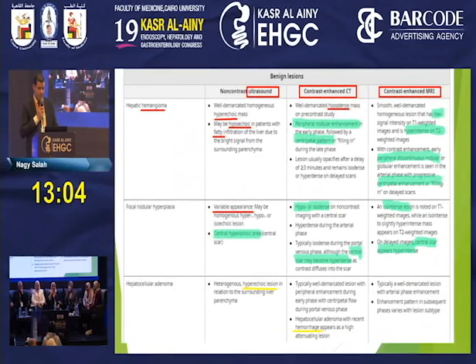delayed phases. Focal nodular hyperplasia has a variable appearance: it may be homogeneous, hyper- or hypoechoic, showing central hyperechoic scarring, hypodense on CT, and with central scarring showing delayed enhancement. Iso on T1 in MRI, and high on T2, with central scarring showing delayed enhancement.